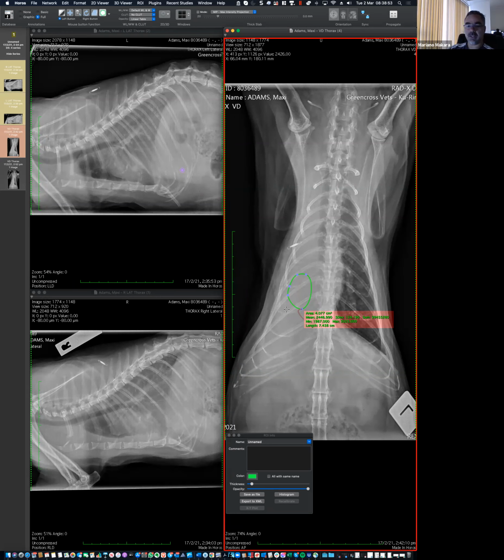And this is not the first case that I've seen like this. So do I see it? No, I'm not sure I see the mass, but it's the explanation that there is something in that airway obstructing the air passage and probably bleeding and affecting all the right lung lobes, with a minimal pleural component, if there is a pleural component. This has no question. And then there is a met. Makes sense? So everything really fits in place for something like a bronchogenic carcinoma.